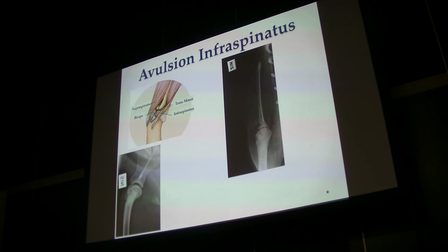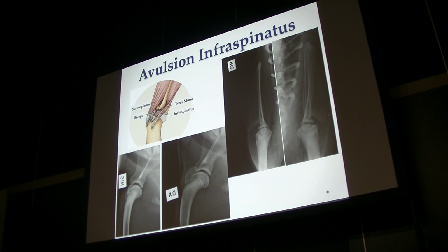And I have images of both sides of this patient. So this is the right shoulder, the left one, and the craniocaudal views.